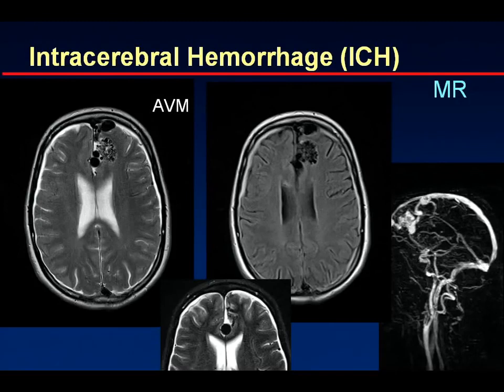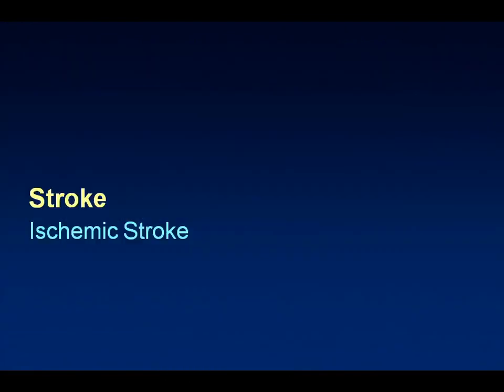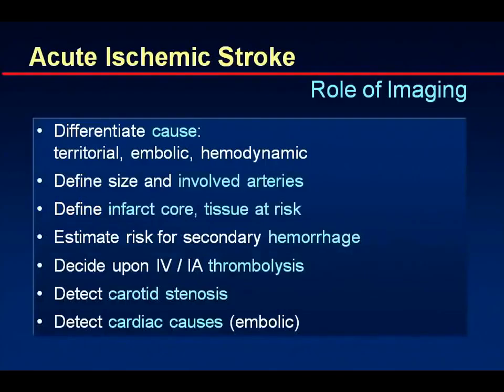You also see that it has some massively dilated vessel. The nidus is actually aneurysmatically dilated. And you can see that MRI is an excellent tool for visualizing that. These small amounts of blood that you can see here are extremely hard to detect on CT and usually are missed.